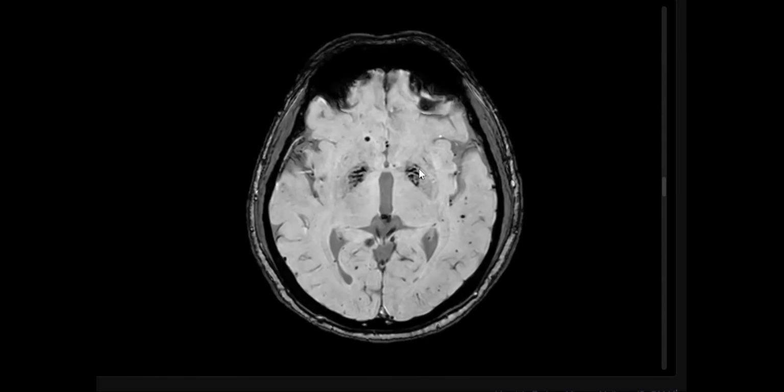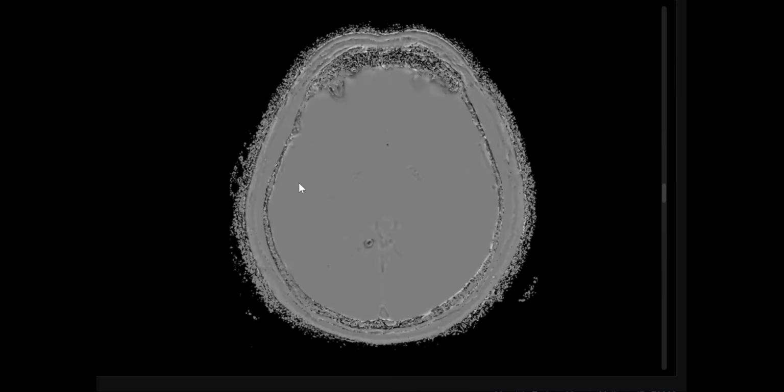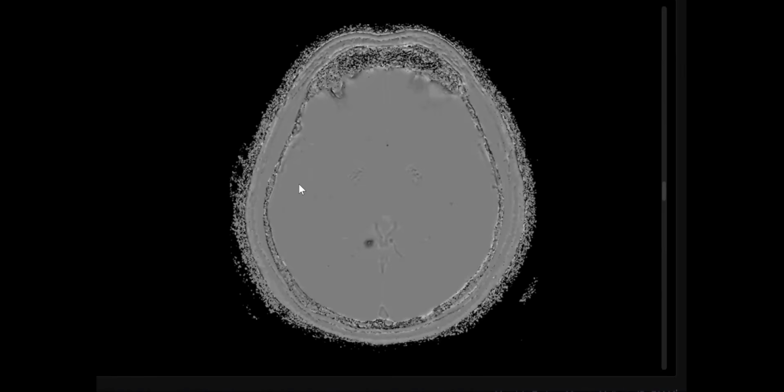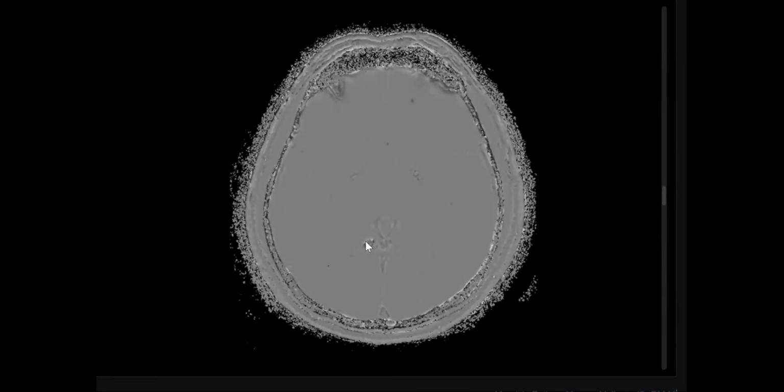How to differentiate if this is cavernoma or calcification? By the next sequence, which is phase. What is the name of this one? It's phase contrast sequence. It will be the opposite of blood if it is a calcification. And in case of blood, it usually follows the signal of vessels. High signal or dark signal? It differs according to the type of machine, GE or Siemens.